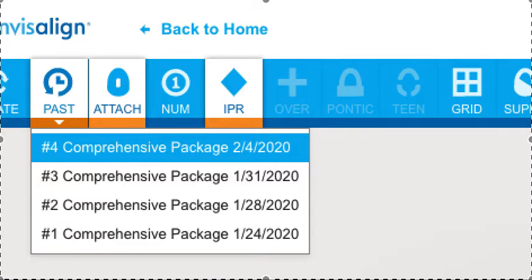Okay, so let me explain the why behind toggling between different treatment plans. For example, let's say you have a 35-year-old female patient, 6 millimeters of crowding, class 1. Okay, pretty standard, easy case, probably an Invisalign moderate case. In this kind of situation, you usually have two options. You can either go extraction, you can go expand and procline, and of course, the direction it's initially going to head on the first ClinCheck is the direction that you have in your clinical preferences.